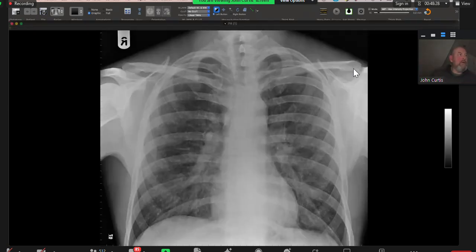Okay, so I'm going to just give you the controls. And again, if I ask you to stop the mouse, it's because I need the controls, okay? Yeah, got it. Fire away. This patient is a middle-aged man who's febrile and sick.